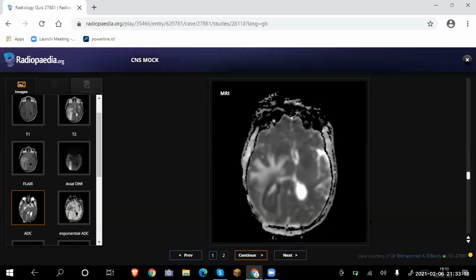Okay. I think, yes, this is an abscess. So maybe it is post-operatively contaminated and gained an abscess. So I would phone the referring neurosurgeon and tell him about this, and just to start the management either by conservative treatment or if it needs any other possible management.